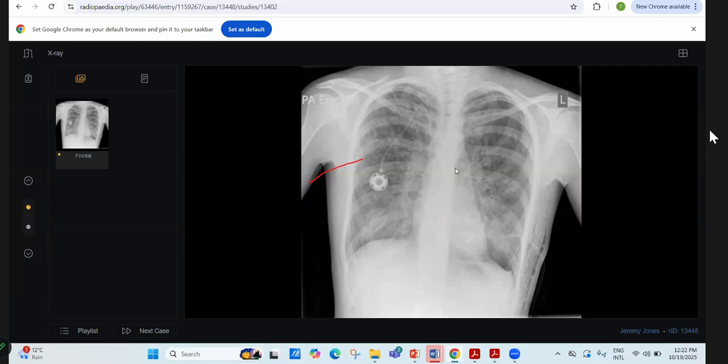I just encouraged you to say, and then you said about the things. Otherwise, you were not confident about this film as well. But the moment you see a young patient with a portacath, with cystic changes, with pneumothorax, it is straight away going towards cystic fibrosis.